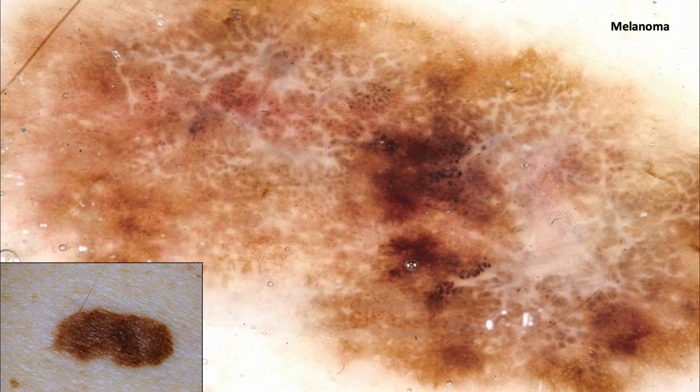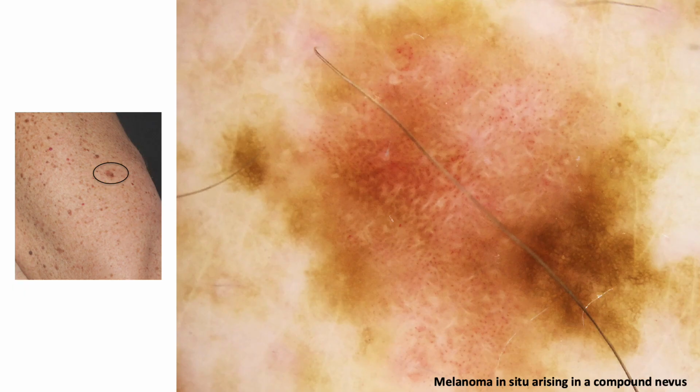Let's look at some good case examples. Here's a clear ugly duckling lesion, large irregular borders, multiple colors, with one of the most beautiful examples of that negative pigment network. You see those elongated brownish structures, right? Kind of globule-like, but more sausage-like in appearance, and that white maze-like background. So good example, negative network.